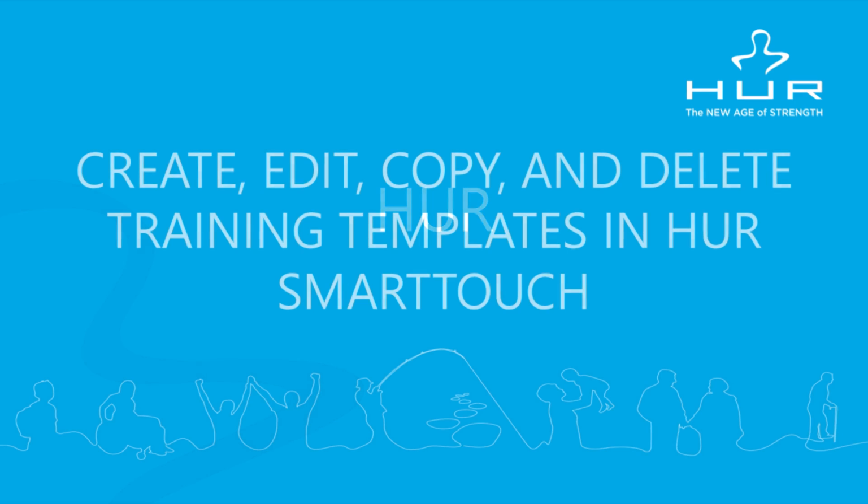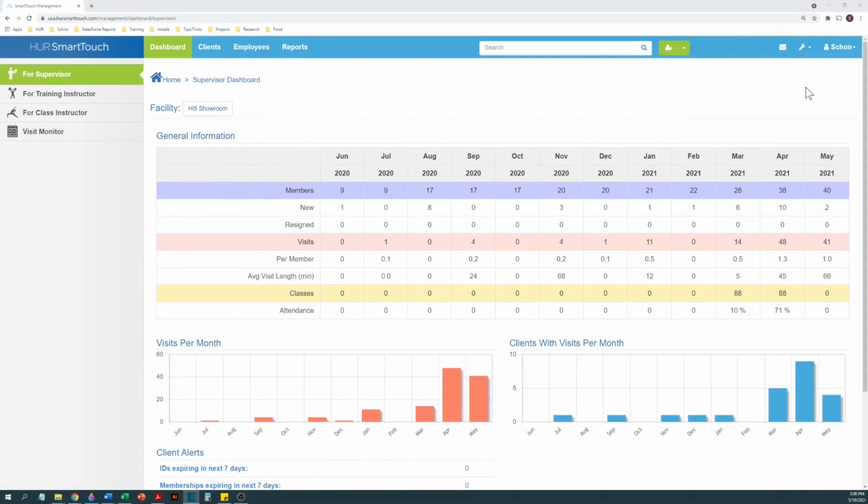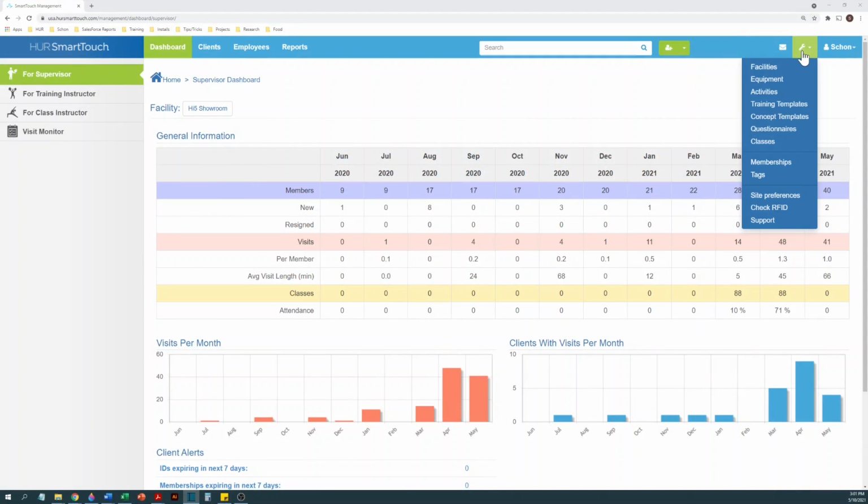Hello everyone. In this session, we'll be looking at how to create, edit, copy, and delete training templates in the HUR SmartTouch system. From any screen, just click the wrench icon in the upper right corner. From the drop-down menu, select Training Templates.